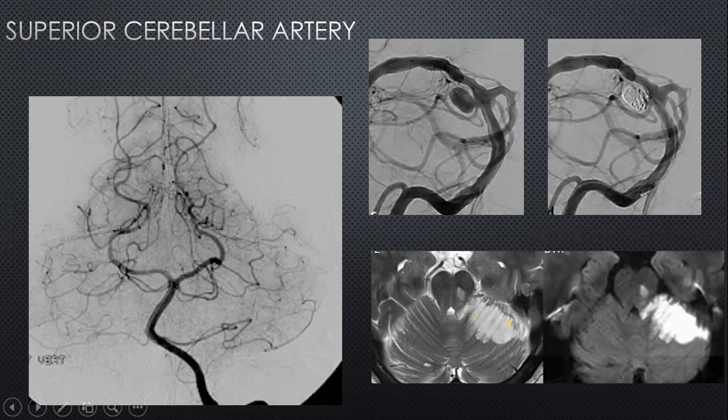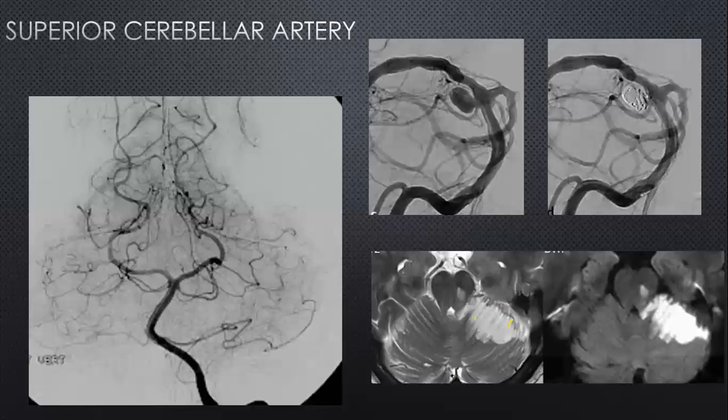If the anatomy is curious, like in these examples, you can get aneurysms from the superior cerebellar artery, and of course the infarction of that artery is going to affect the brainstem, which is supplied from the superior cerebellar, especially the inferior aspect of the midbrain and the superior cerebellar hemisphere, as in this patient, where the superior cerebellar not only supplies the cerebellum but also supplies the midbrain, typically the dorsal aspect of the lower midbrain. So it's important to realize that the cerebellar arteries not only supply the cerebellum but also supply the brainstem.